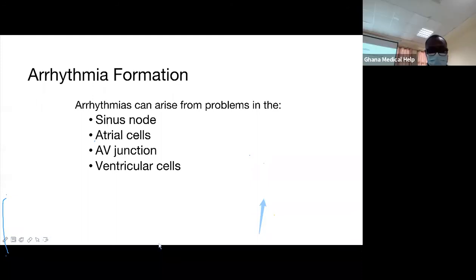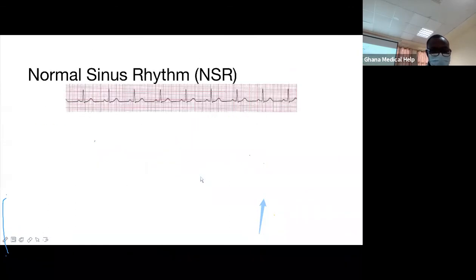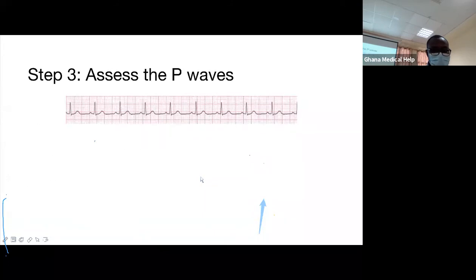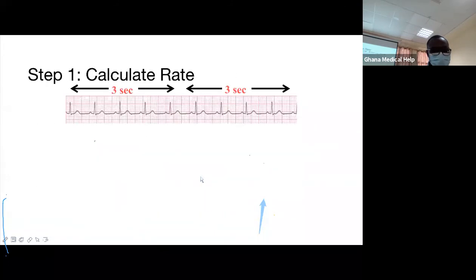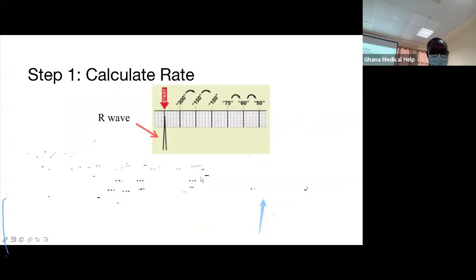The calculation of the rate. All right, so there were two ways of doing it. Let's go back to that. One way, the common way, is option 2.